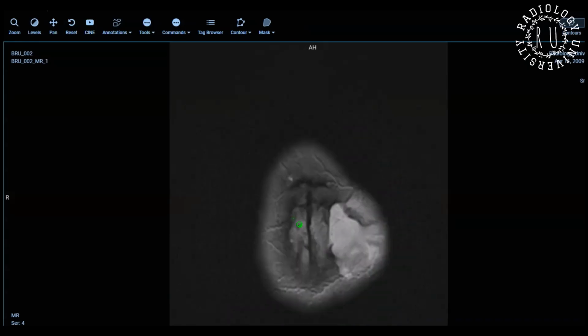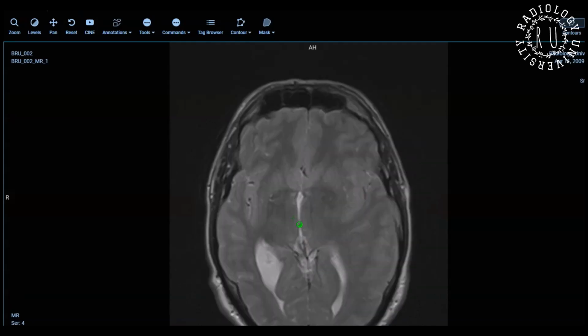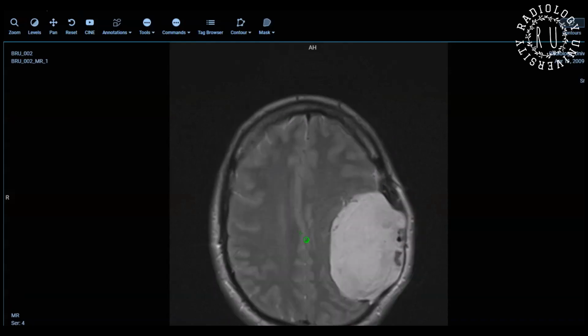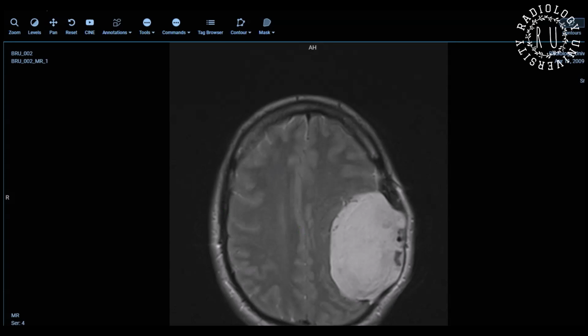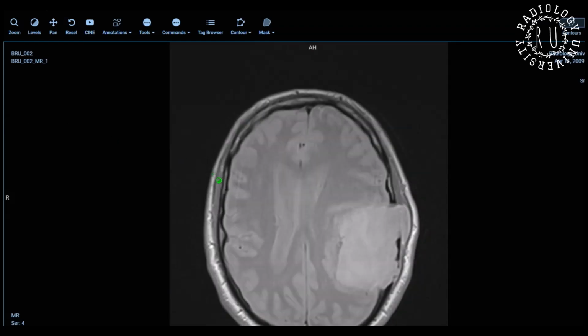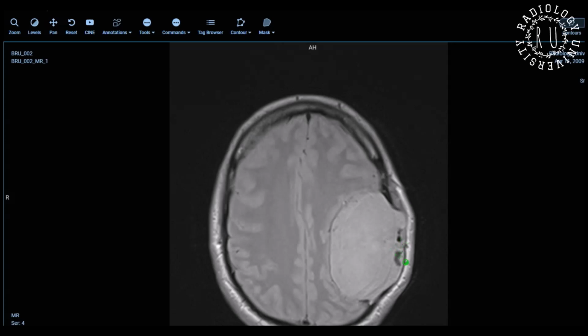That's just a T2 image. It appears to be largely T2 hyperintense with areas of serpiginous T2 hypointensity, giving rise to a flow void. So I suspect there's some peripheral vascularity associated with the lesion. You're talking about these things.